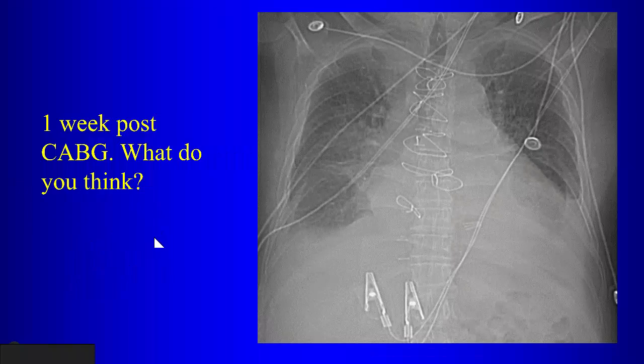Okay. One week after coronary artery bypass graft. Any problem? That inferior sternotomy wire looks out of place. Yes, that inferior sternotomy wire is not where you would expect it to be.